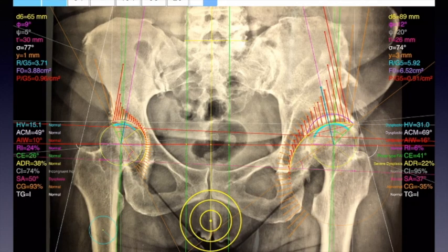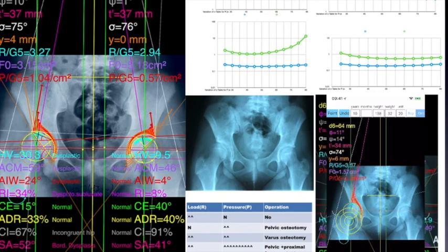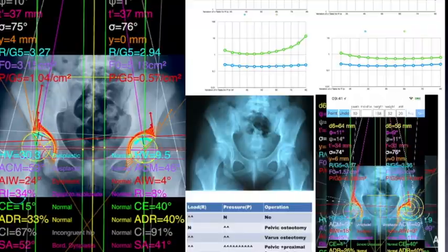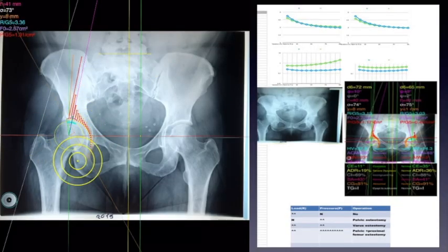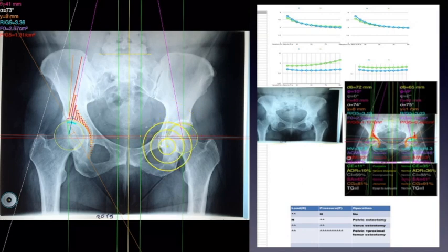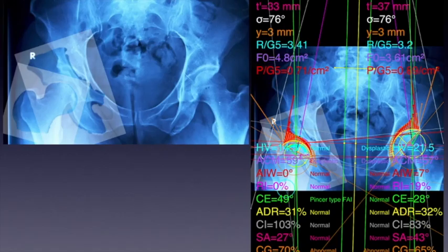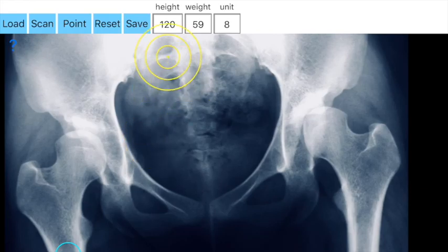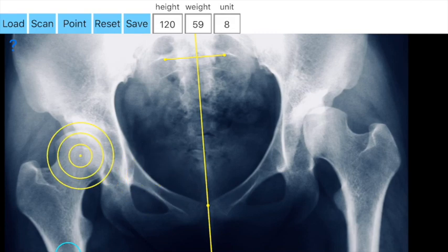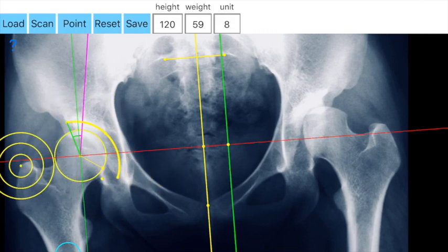The distribution also of compressive stresses over the acetabulum, which is usually associated with radiographic sclerosis over the acetabular margin, are printed in real time over the screen and thus can be easily and objectively evaluated. Besides that, the app provides for all indexes and measured data an export module for diagrams of load, R, and pressure, P, which each can be plotted as a curve, allowing easy comparison with normal data and thus helping the orthopedic surgeon decide which procedure is objectively indicated.